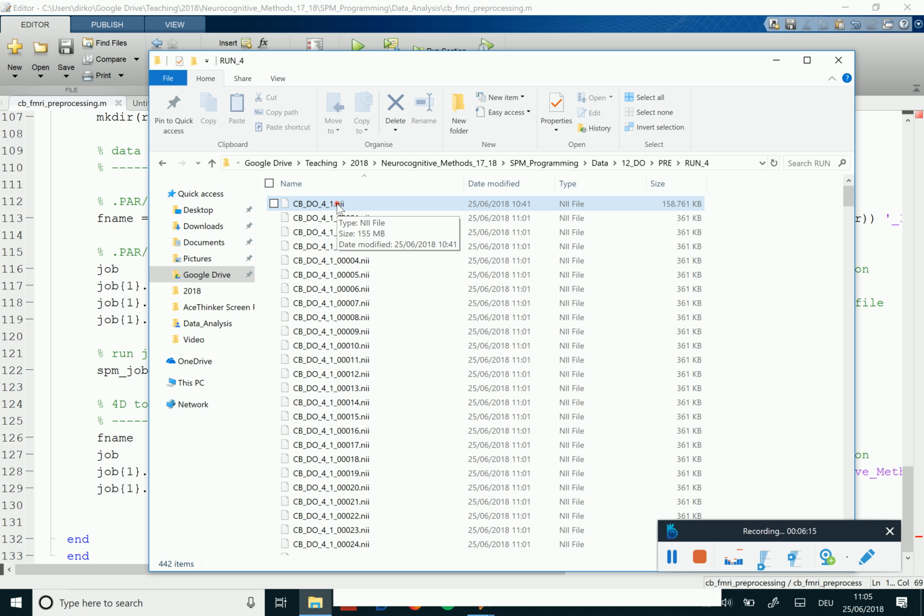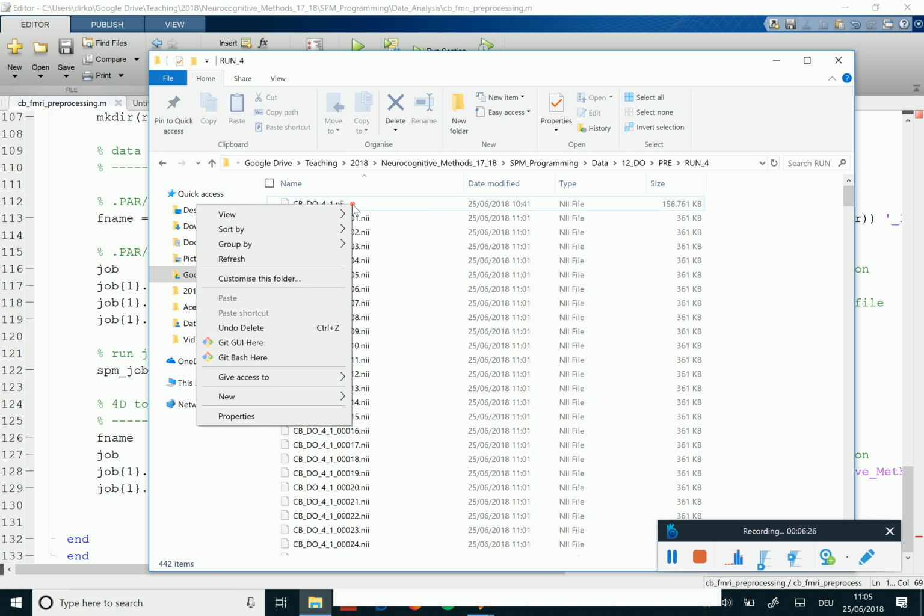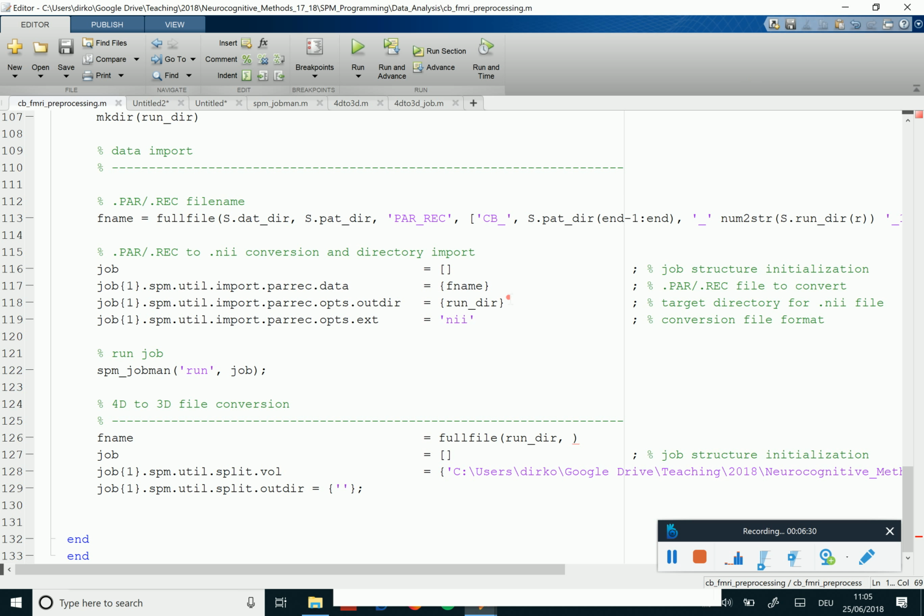already at this point one could use a filter. So later on we will not specify each file name individually, but here we might as well still do it because we only have one file. So we can use again this trick here. That's this part.